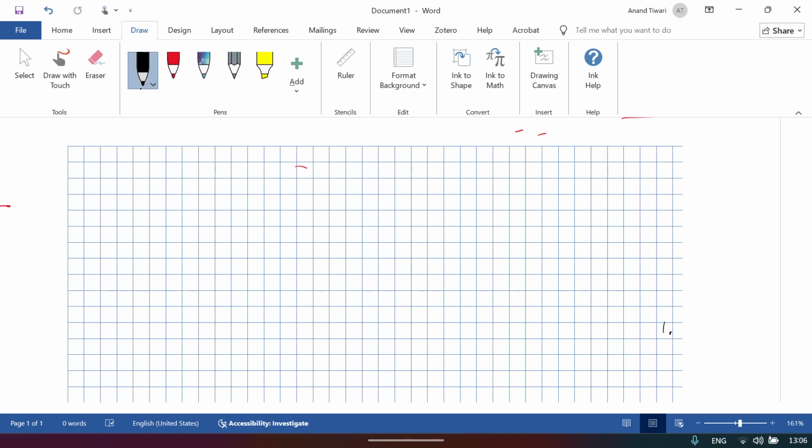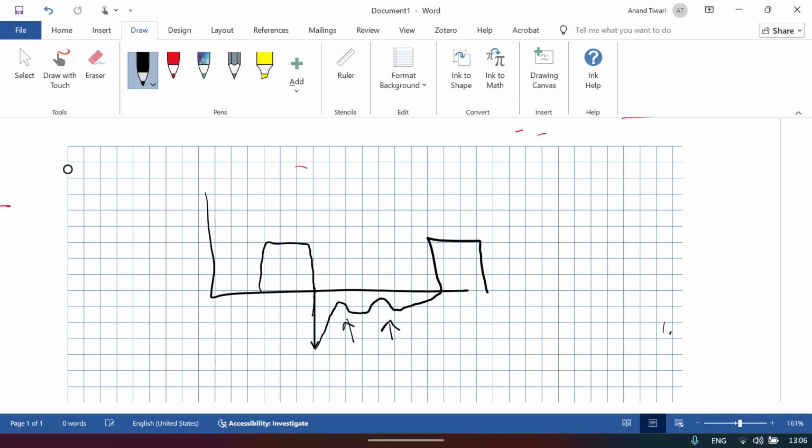Now another one I will show you about the asynchrony problem. Suppose you have kept the inspiratory time short, and this is the flow time curve, and in expiration you see that it goes like this. Then again there is an upward deflection, and then there is the next breath. So these two deflections are the wasted effort of the patient. These are the inspiratory efforts which were made by the patient, and they failed to trigger.